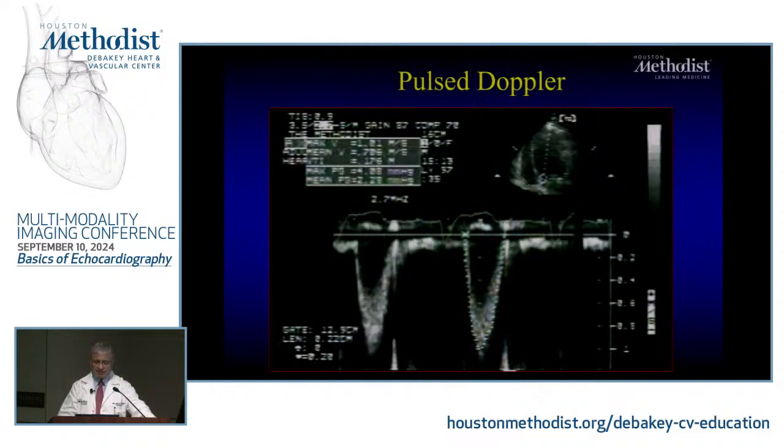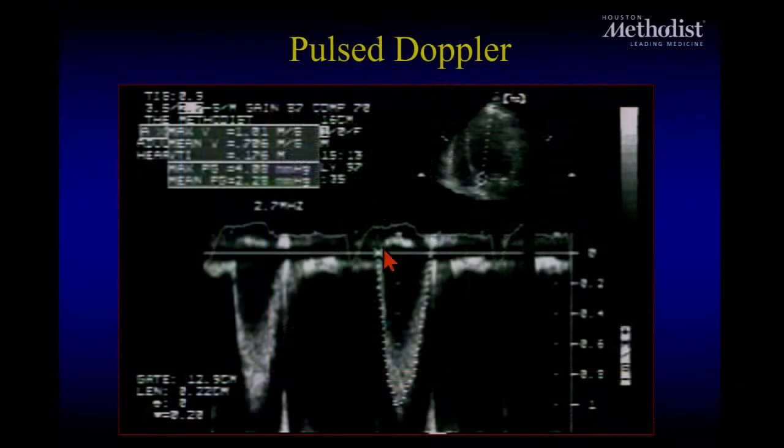So this is an example in the LV outflow tract. So I have in early systole, all the red cells, basically this is a reflection of the red cells, what they do, all the red cells are going at the same speed. When they start slowing down a bit, you may have spectral dispersion, okay?